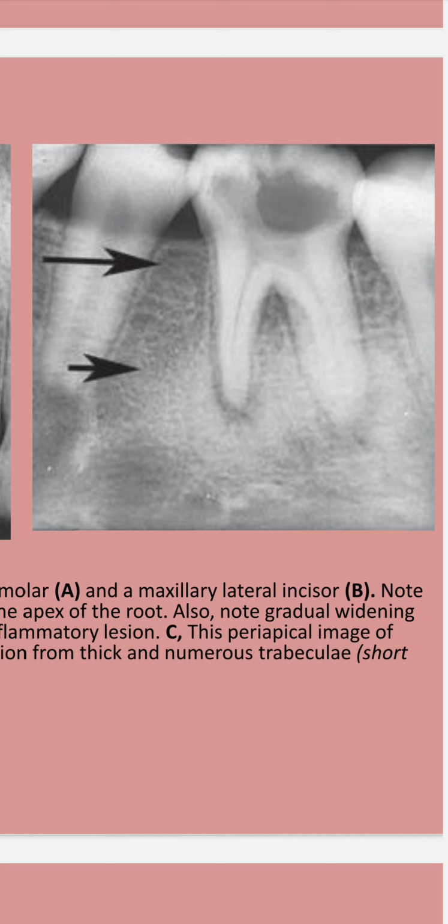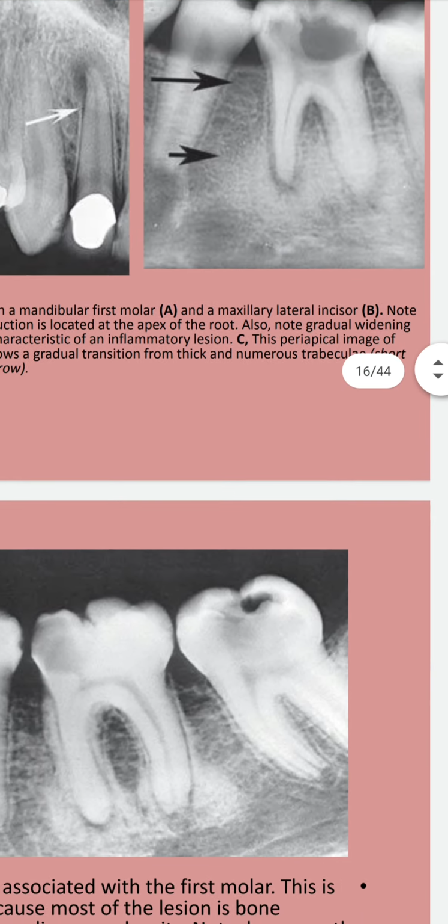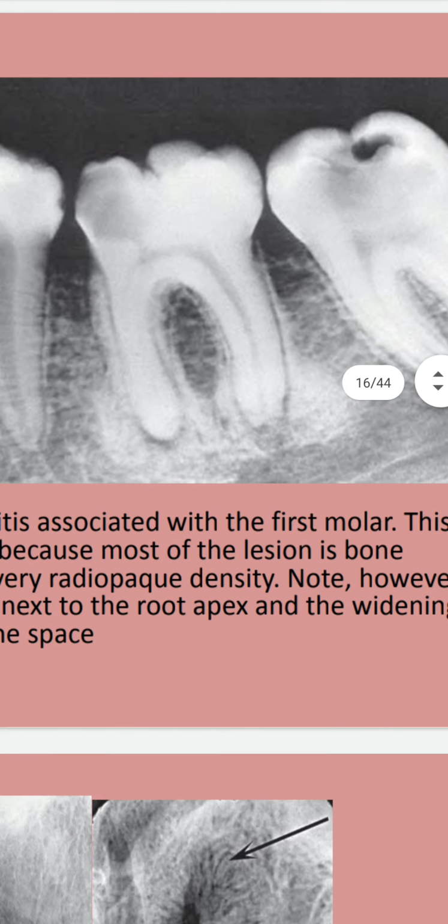a pathological condition called sclerosing osteitis. This is caused by a defense mechanism and hazy accumulation of bony trabeculae due to chronic infection that causes sclerosis of bony trabeculae, causing the condition named sclerosing osteitis. As you observed in this image also.